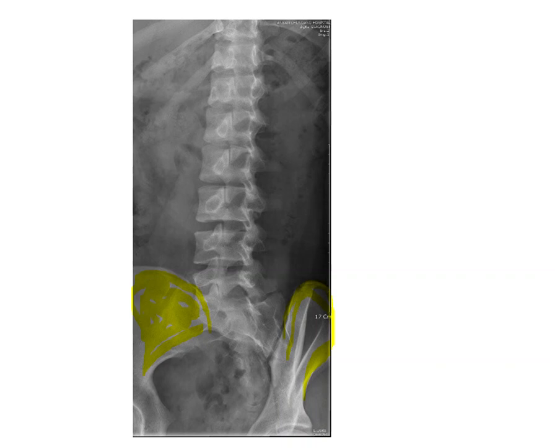So now this little Scottie dog that I was talking about lives right here in the center of the vertebra. I'm just going to try to outline him a little bit here. See a little bit of a leg here, and then his back, and then a back leg here, right? So that's what we call the little Scottie dog.